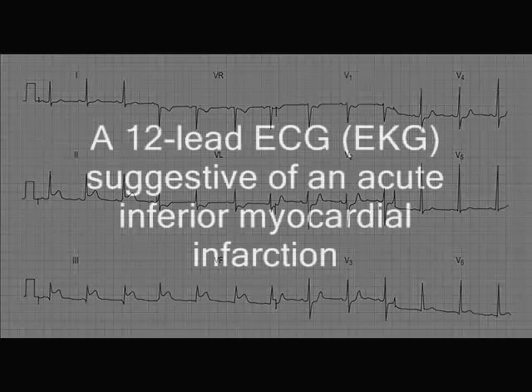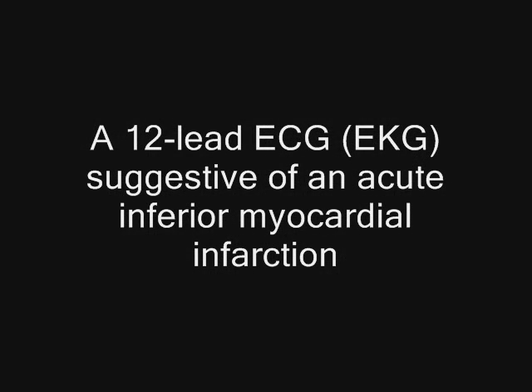So what we're seeing here is a patient with a very steady heart rate, they're in sinus rhythm, and they are demonstrating signs of an acute inferior myocardial infarction. But again, you use the 12-lead ECG as part of a holistic assessment, and you need to see other signs, clinical history, and other measures such as biochemical markers to be absolutely certain that is what the patient is experiencing.